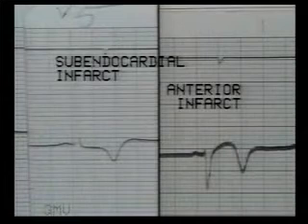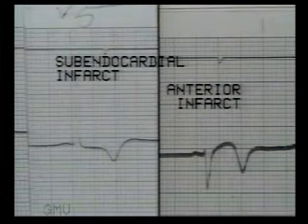At this stage, let us remember the picture of anteroseptal infarct, where the ST segment is elevated and the T wave is inverted. Compare here on the left ST depression in subendocardial infarct and on the right ST elevation in anteroseptal infarct, both with inverted T waves.